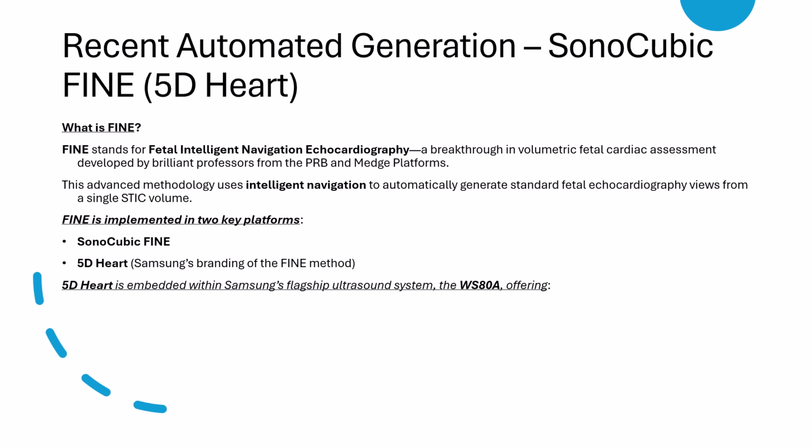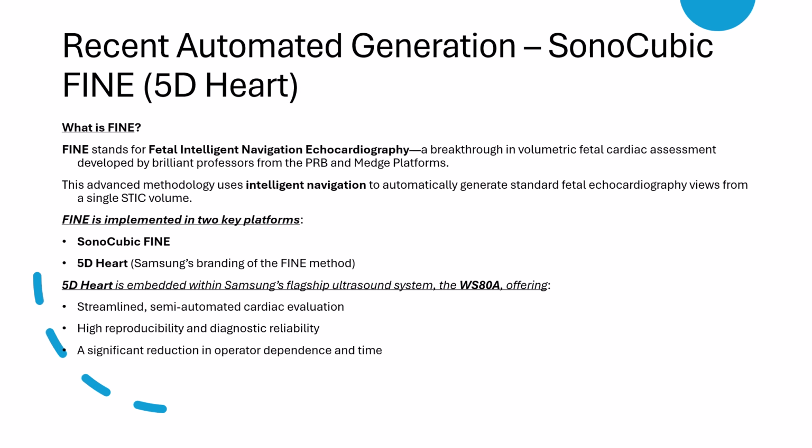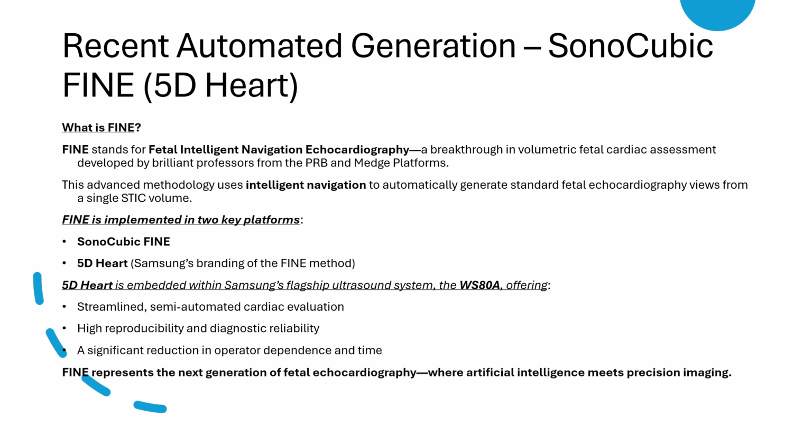It offers a seamless, semi-automated cardiac evaluation, high reproducibility and diagnostic accuracy, a massive drop in operator dependence and time spent per case. FINE is the moment AI stopped just assisting and started transforming prenatal echocardiography. This isn't just automation, it's intelligent navigation with real clinical impact.